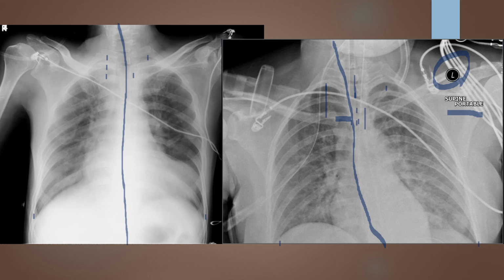So again, I look for technique as well. This has a nice long grayscale. I see soft tissue detail. I see bony trabecular pattern. I can identify good lung markings. So the contrast on this is really good. The penetration is good. I'm able to penetrate the radiopacities of all the patient's lines and tubes. So that is very helpful.